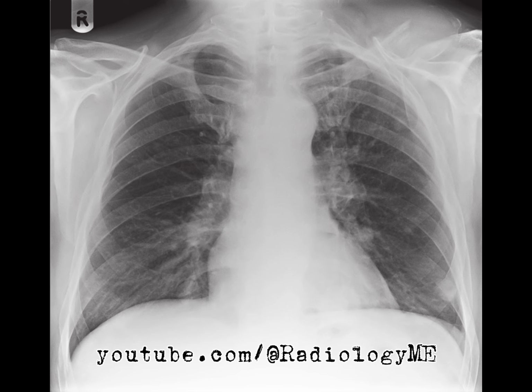To sum up, I'd conclude, the constellation of findings, pulmonary nodules, bulky hilum, and osteolytic destruction of the clavicle, leads me to believe that this is a case of metastatic disease, most likely from bladder cancer. The next step would be to confirm the extent of disease with staging CT and potentially PET imaging.